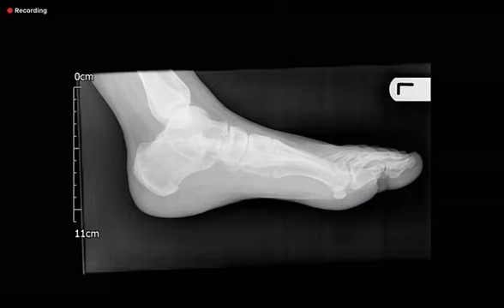Please remember that talar beaking is not a specific sign for talocalcaneal coalition. If you go back to the basics of coalition, the most common, and equally common, are talocalcaneal and calcaneonavicular. In both of them, the dynamics of the foot is deranged, and that is why there is talar beaking. It's a sort of degenerative change, which should not happen in this age group. Once you pick that up, you start thinking what is happening.